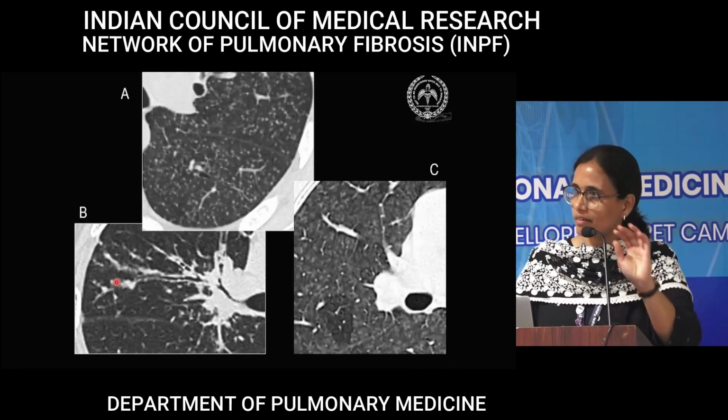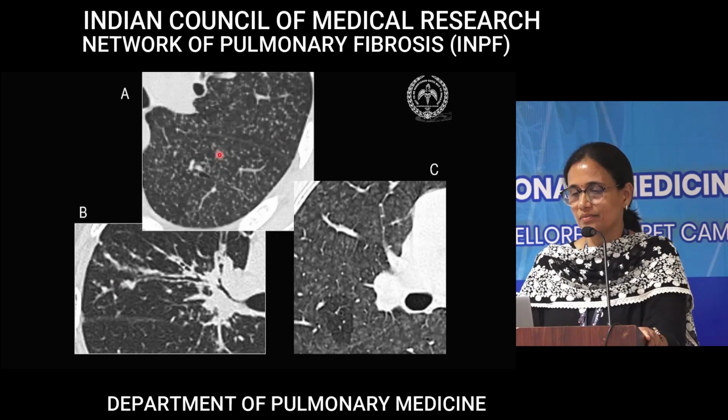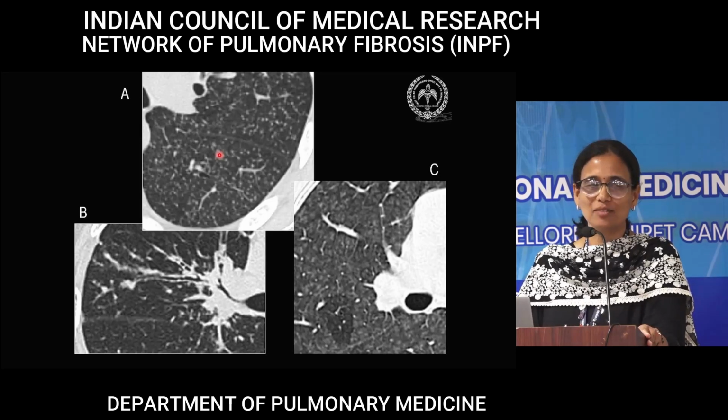Just a very short recap. Yeah, we have time. A, what is this? Distribution? I think now everyone can answer, please.